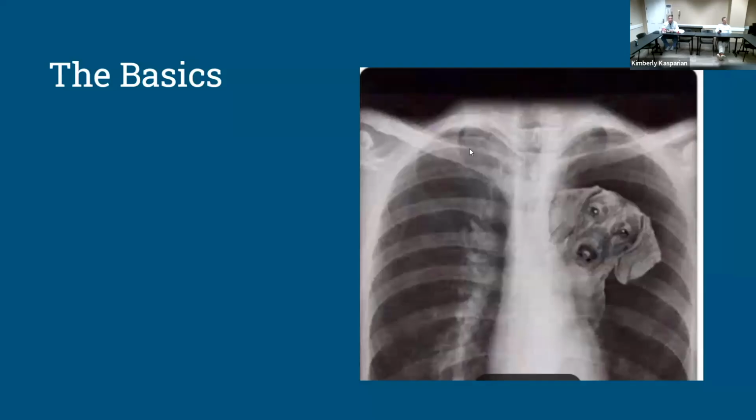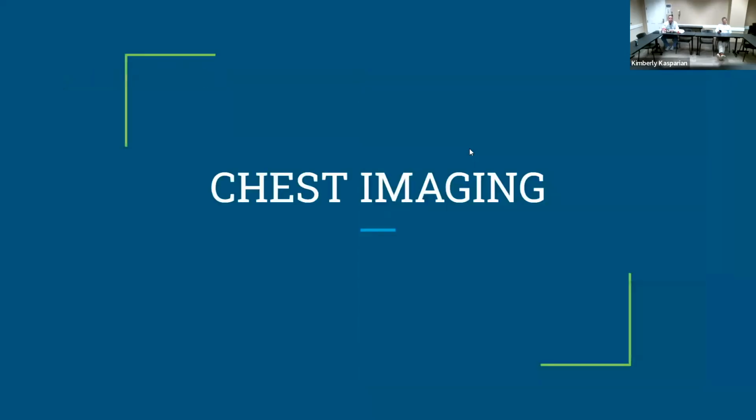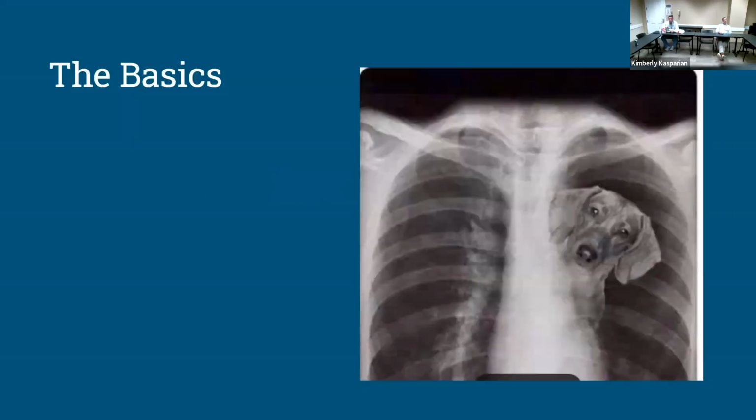All right, so basically chest imaging lecture. This is just chest X-rays. It's going to be a very brief intro and then basically just case-based, so that everybody participates, and y'all just think through it. I mostly want to focus on a couple of normal and abnormal findings and how to describe them, so that if you ever have to relay what a chest X-ray looks like to somebody, you know what a differential is and how to verbally describe it, which can sometimes be kind of tough.